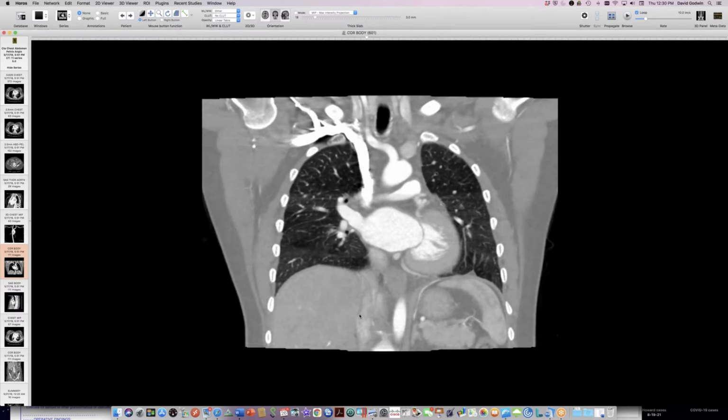Yes, that's more familiar. Yeah, and it's associated with parachute mitral valve as well and subaortic membranes that contribute to the stenosis. That's actually why she had her mitral valve replaced, not because it was stenotic, but because I think there was a parachute valve. I'll take that case out and show it next week.